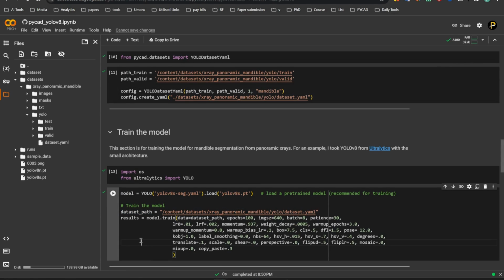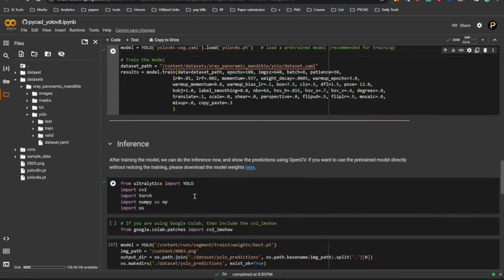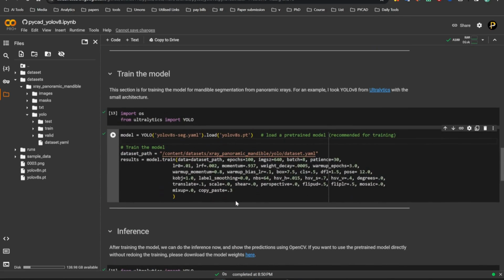Okay, so I have already added these, because I didn't want to just show you how to prepare a dataset, but I added the whole example. This example is directly from Ultralytics. For this example, I am using the YOLO small architecture. I trained the model for 100 epochs just to test. I don't have the outputs here, but the model got about 87, I think 87 or 85%, for the validation mean average precision, not accuracy, sorry.